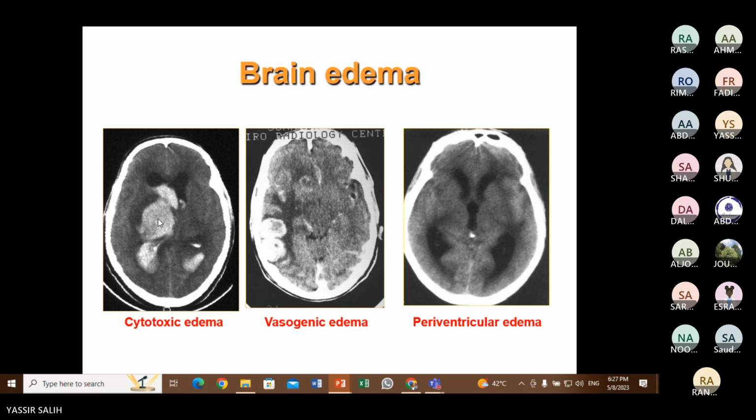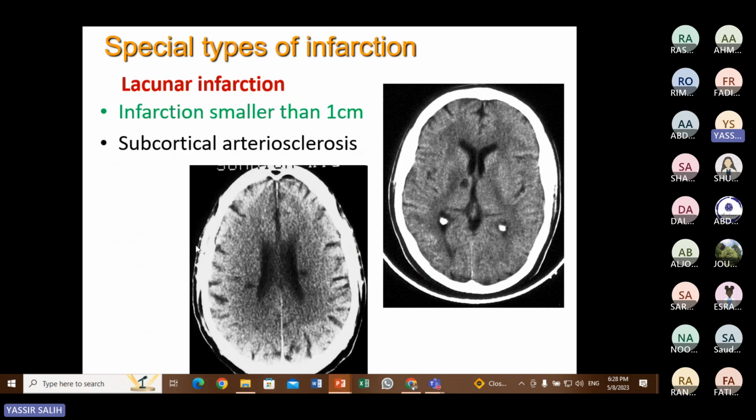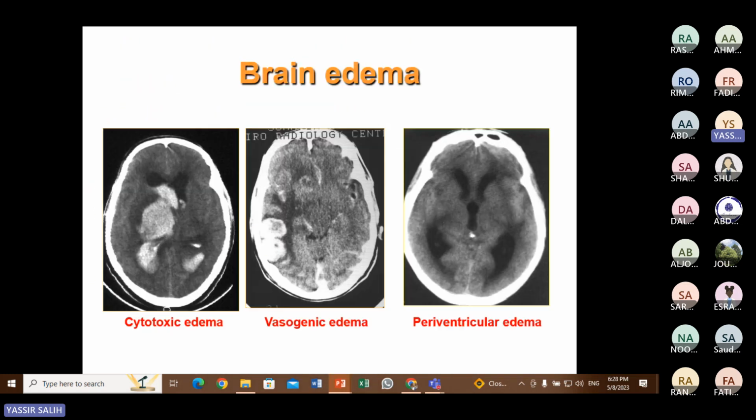Doctor, here there is a dense artery sign. Then where is the artery that appears hyperdense? You mean this? Yes, this is a calcification in the choroid plexus. Normally the choroid plexus in the ventricle can be calcified. This is normal, physiological calcification, but it is not the area of the artery. This is a calcified choroid plexus.